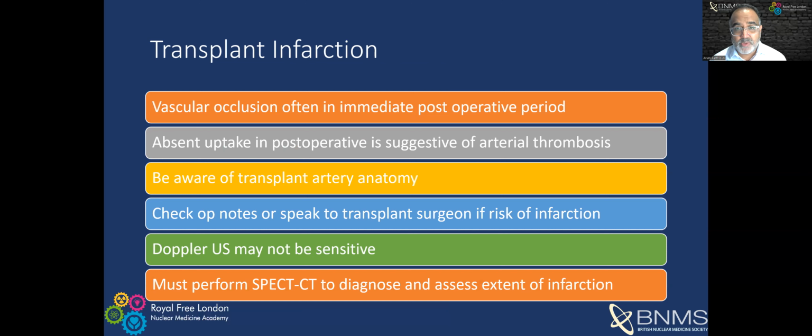But you need to be aware of the transplant artery anatomy, because if you've got more than one artery, it may be hard to visualize thrombosis of a small accessory transplant artery. So check the op notes or speak to the transplant surgeon if you think there might be a risk of infarction.